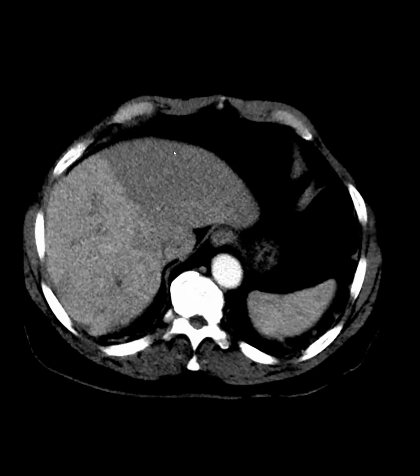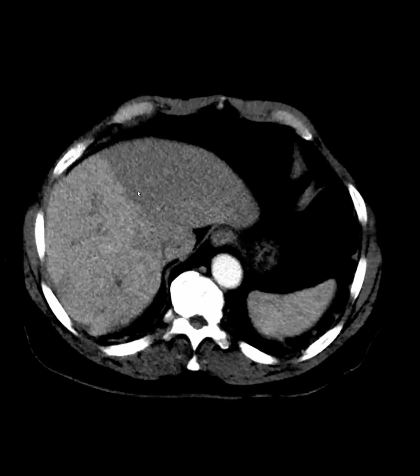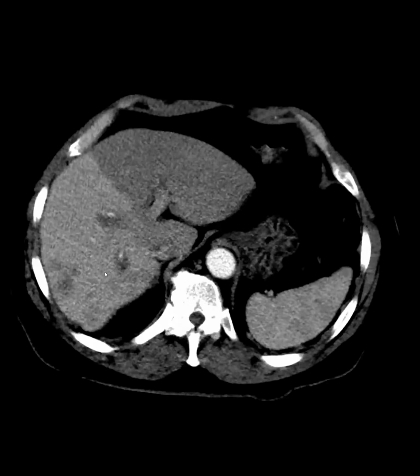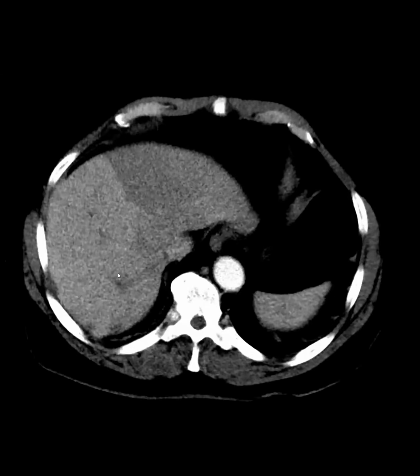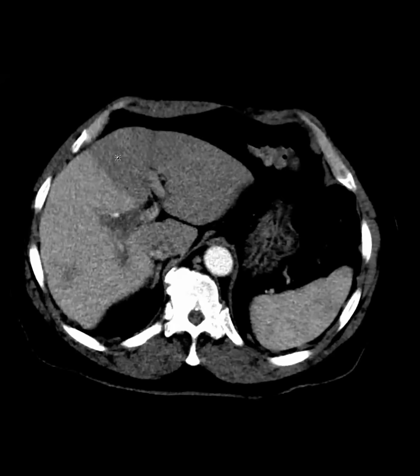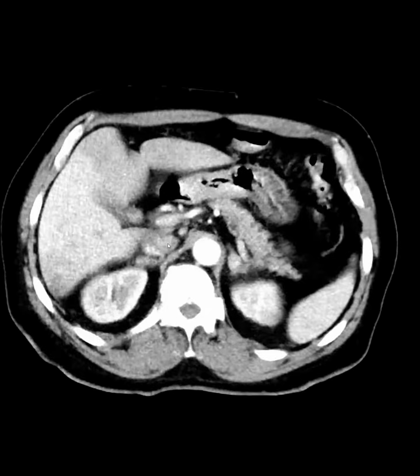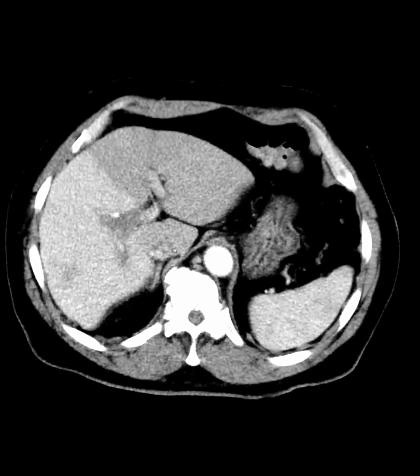You would think you'd be concerned about the dark side, like, is it ischemic, is it infarcting? But that looks homogeneous and nice. Even if it's not homogeneous, the side you should be concerned about when you have a geographic abnormality here is the bright side. That suggests the hepatic artery is taking over and there's something wrong with the portal vein on this side. It's counterintuitive. Every time we see it bright here and dark here, people tend to think the dark side is abnormal. But anyway, now we focus on the portal veins.